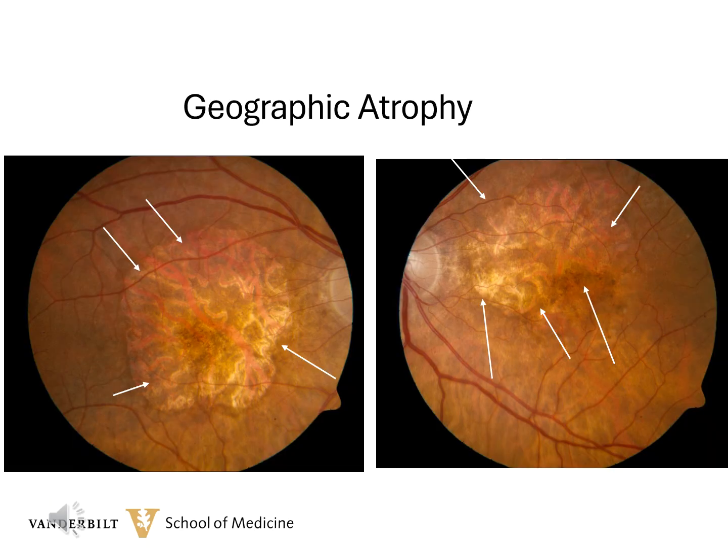Here's a patient with bilateral geographic macular degeneration. The arrows point to the sharp demarcation line between normal RPE and absent RPE. Inside the geographic area, not only is the RPE totally atrophic, but also the outer segments of the retina and also the choriocapillaris. You can see the large choroidal vessels. Some are red, carrying blood, and some are sclerotic.